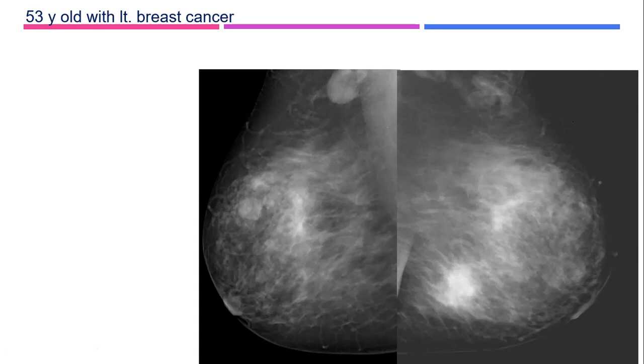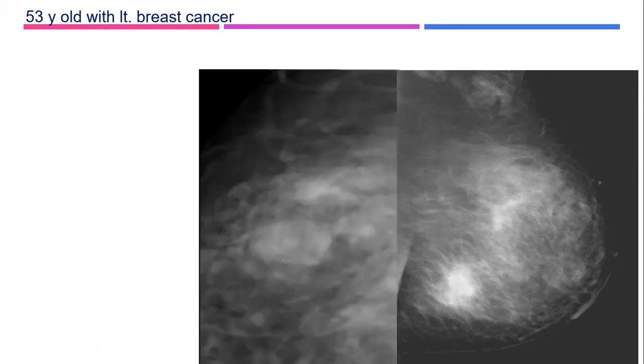No, but because you told me that's a cyst, ultrasound. It was a cyst, yeah. You will see it. I'm going to show it for you. Yes, I think it was with a ring. No, it is. It was a cyst.